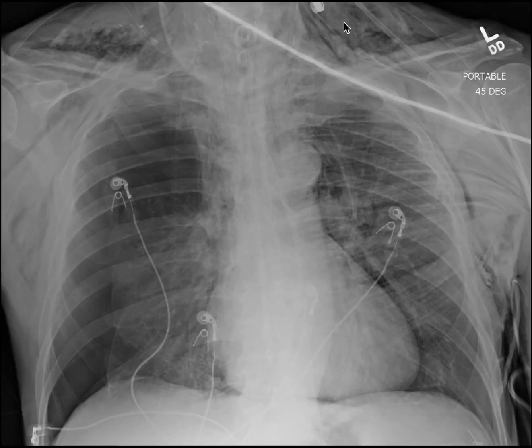All right, now let's go to the other side, this side. Now, the question you have to ask is, is there also a pneumothorax here? Now, we already said there's likely a deep sulcus here, and it looks a little bit lucent here above the left hemidiaphragm. And look again, there is very significant subcutaneous air, not only overlying the left trapezius muscle, but overlying the left latissimus muscle as well.